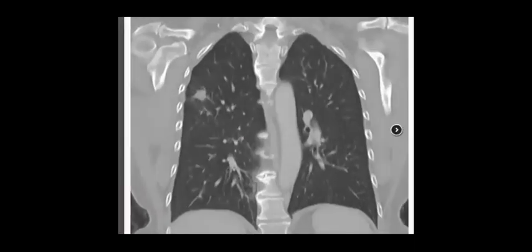Ala, so rounded lesion, speculation. Again, what do you find in the PET, is it high uptake, low uptake? What do you think? Yeah, it's a high uptake here. So number one, a mass lesion in the lung with high uptake.